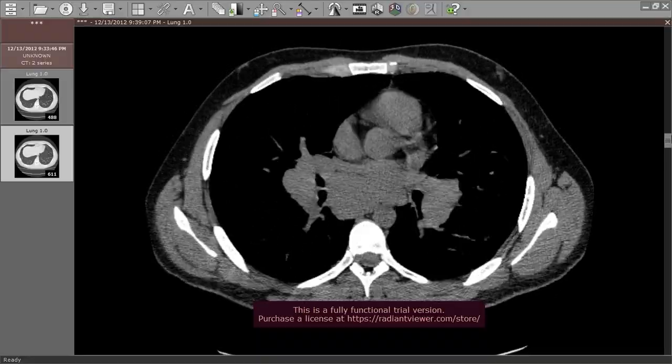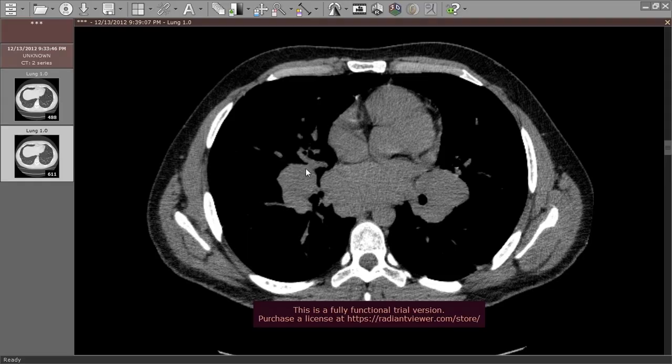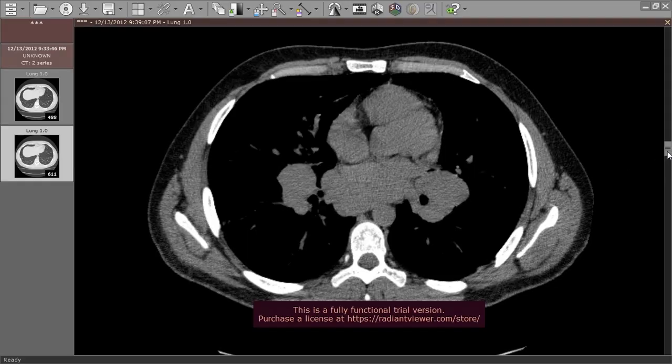In such a case, because of the affection of the hilar region, we have to put a differential diagnosis of both lymphoproliferative disorders such as lymphoma and sarcoid disease.